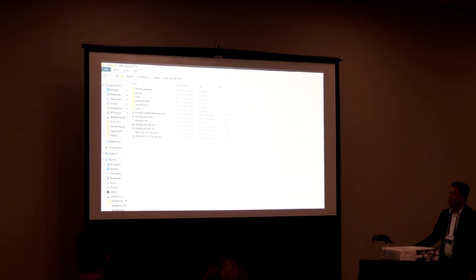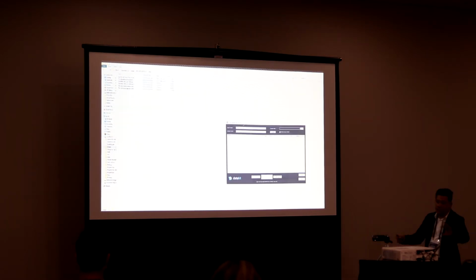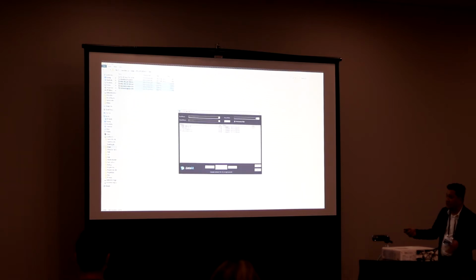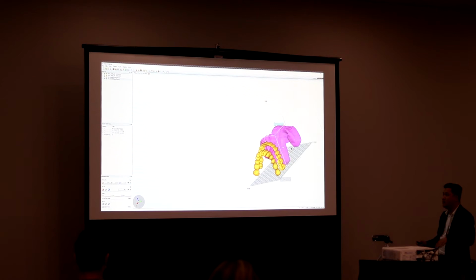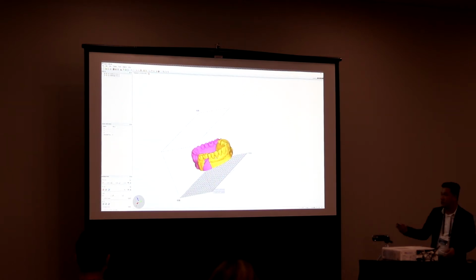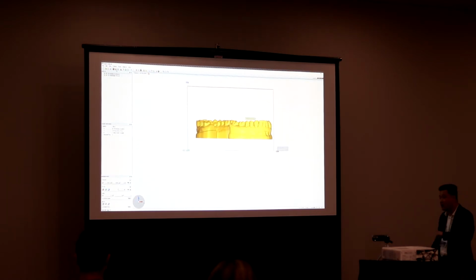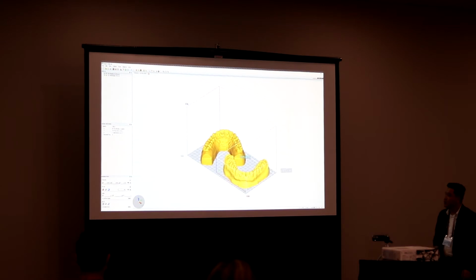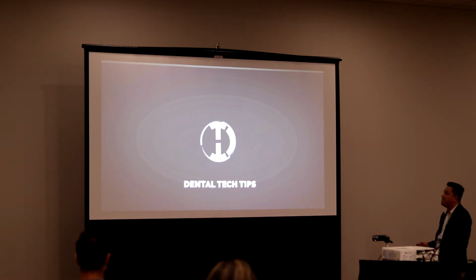And then of course you have, next is a backup folder, don't worry about that too much. Then you have your CAD folder. This is a very important folder as well, especially for some of these workflows, because it contains the actual finished CAD files. And a very quick dental tech tip here is if you ever have a problem generating CAM, just go ahead, convert these files. They'll convert it to an STL, and you can grab these, bring them in. The only caveat is, of course, that it won't be in alignment, but most CAD software, most nesting software will allow you to place these and rotate them in proper orientation. So if you ever need to, you can grab those files from there as well and use those. So that was just a little segue there. But going back to it, that's my dental tech tip for the day.